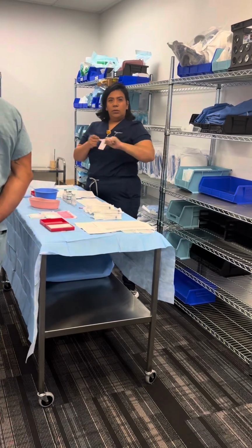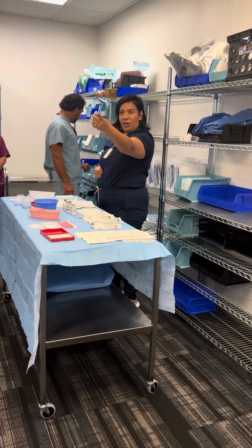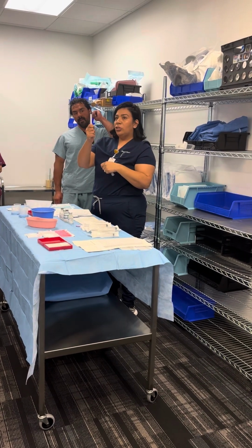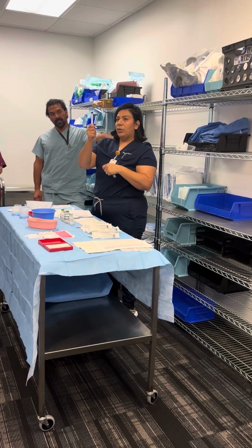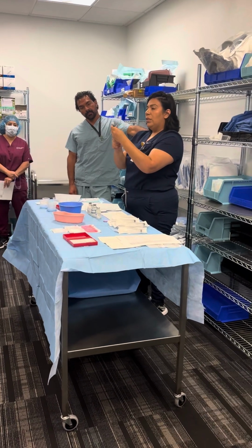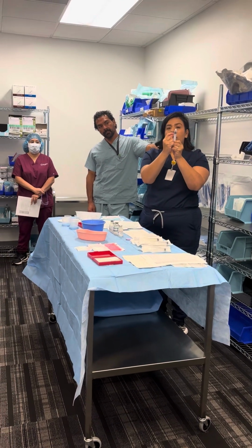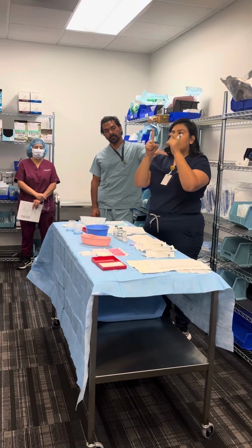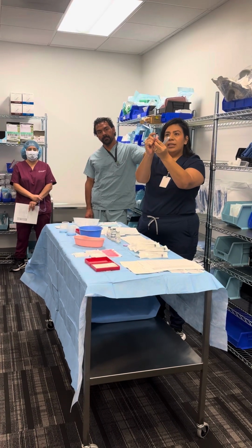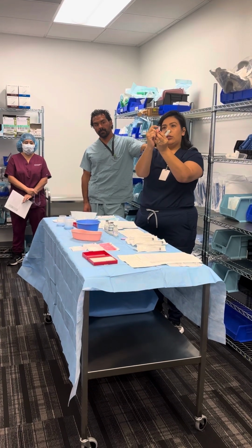Is it CCs? Like a certain amount of ml. So what is this? Barrel. Okay. What's this? Plunger tip. This is a plunger. Okay. So when you're reading this, you're reading not at this bottom line, but you're reading at this very top line. Do you see how it kind of comes to a point at the very tip? Yeah. So you're always reading this here, not the second one, and definitely not the third one.